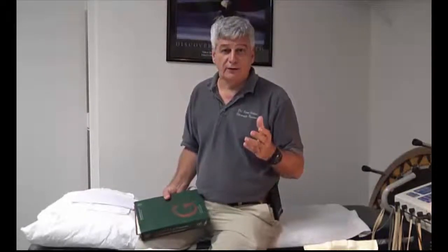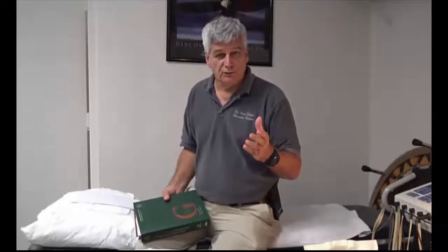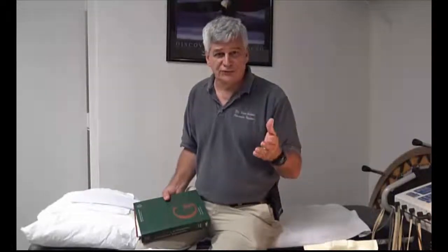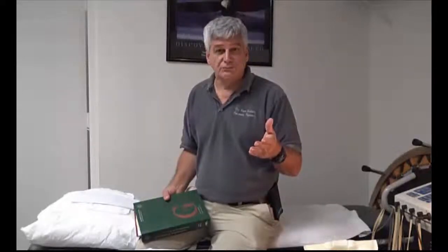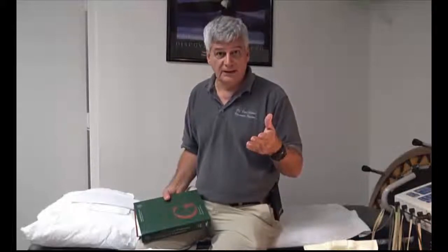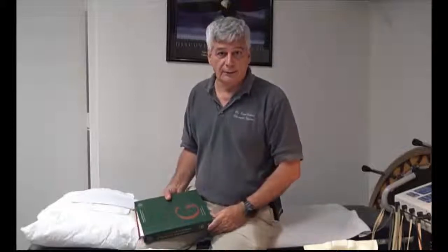So for those who sit back and think that this objective evidence we're generating with video fluoroscopy is nothing but soft tissue damage and it doesn't matter, guess what? The insurance companies have pulled the wool over your eyes. There is significant damage here, and you need to defend your client against that.